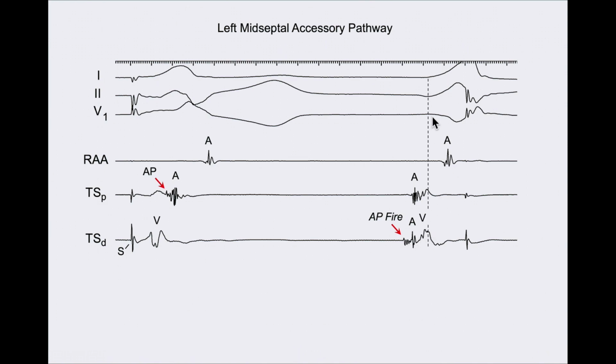Here you can see the onset of the QRS complex, and you see ventricular activation here about 20 milliseconds before you have ventricular activation. But actually, that's not why I'm showing you this example. The reason I'm showing you this example is you can see the ringing in this electrogram that told us that the notch filters were turned on. And it didn't have too much impact on the distal bipolar electrogram. We could tell that this was the real signal, that this was the pathway potential.